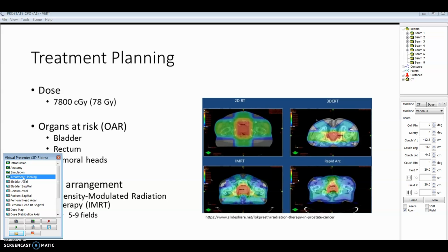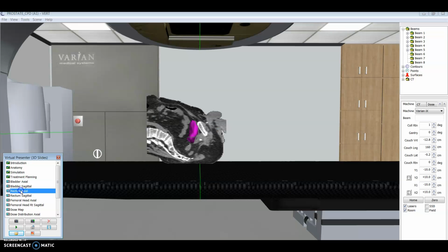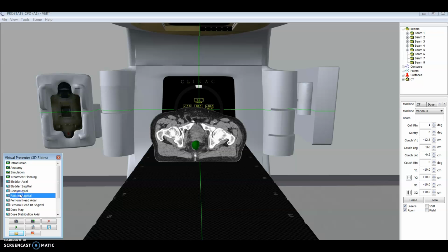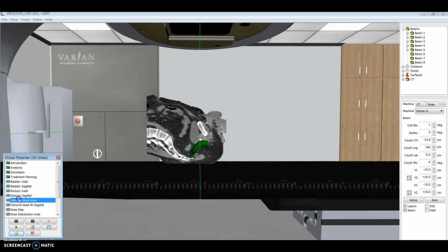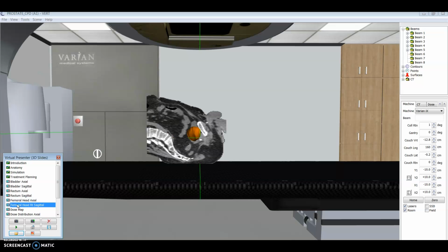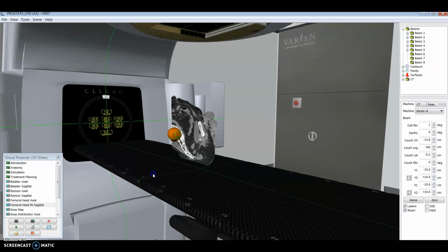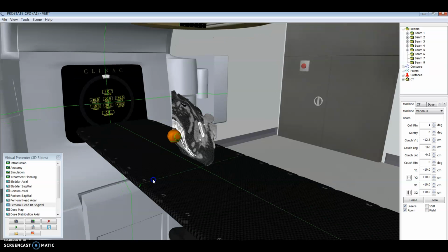And as I've just discussed the anatomy of the male pelvis, I can use the VERT to visualize the contours of the organs at risk in radiation therapy of the prostate. These slides are essentially screen captures taken with a patient and equipment in a position that allows for visualization of the contours. This is where the VERT system gets the most use. With the virtual presenter function, all of the capabilities of the VERT are available, so I can manipulate the patient and the equipment as usual.